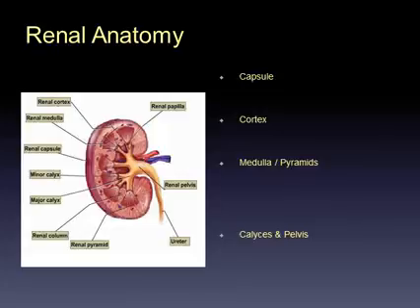Taking a closer look at the anatomy of the kidney itself, we have the outermost layer, which is the renal capsule, also thick connective tissue that is white and hyperechoic, but frequently closely opposed to the fascia and showing as one white line together. Beneath the capsule is the renal cortex, which contains the nephrons. Now, in the healthy patient, this is at least 1 centimeter thick and should have a similar, slightly darker echogenicity to the liver. If it is very much brighter than the liver, this may indicate some underlying pathology. Beneath the cortex lie the medulla and the pyramids, being these triangular or pyramidal shaped structures.